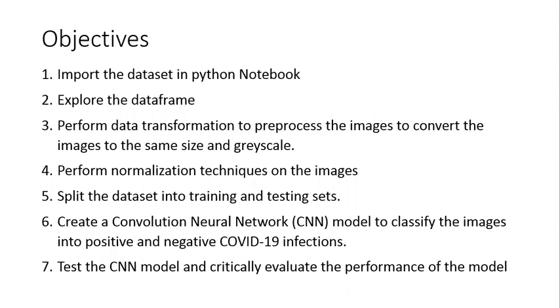So we used a Python notebook and explored the data frame in Python. Now, we perform the transformation of images: resize to 100 by 100, convert to grayscale, and perform normalization. Split the dataset into training and test, and then create a CNN model to classify COVID positive and negative patients. We also perform test, model evaluation and performance rate.